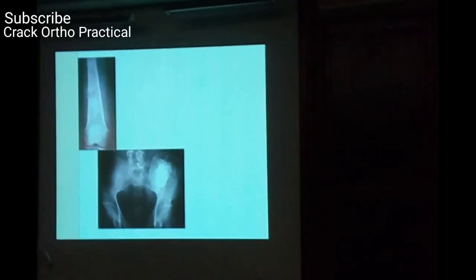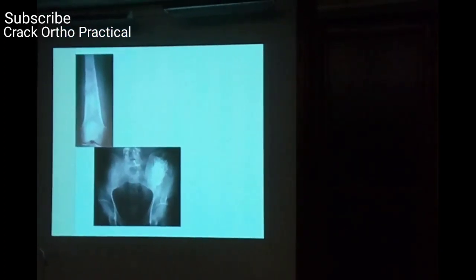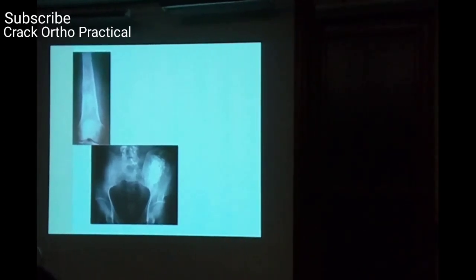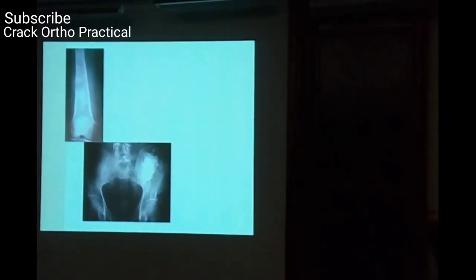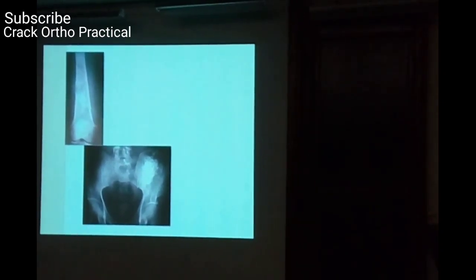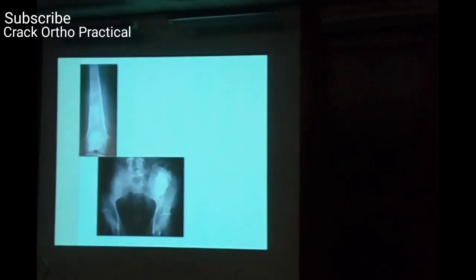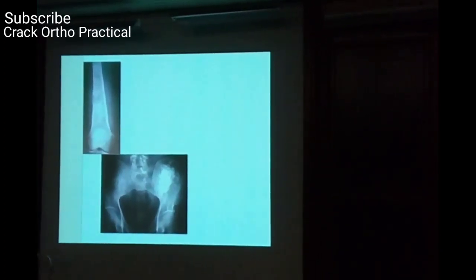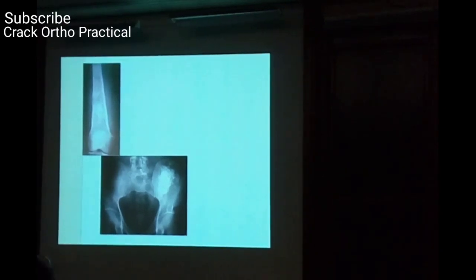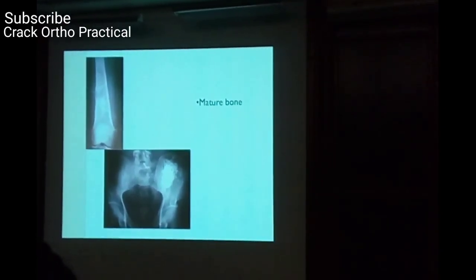So is it a malignant or benign tumor? Malignant, looks like malignant. Why do you say that? Sir, margins are ill-defined, I think. Margins are ill-defined, so which kind of tumor is it? Chondrosarcoma, because of the calcification.